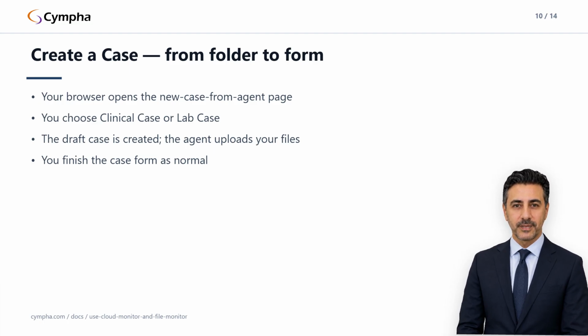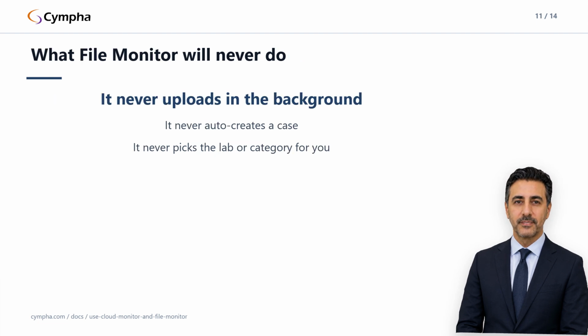Three nevers, and they're the design, not a limitation. File Monitor never uploads a file in the background. No scan leaves your machine just because it appeared in a folder. It never auto-creates a case. A case exists only when you click Create a Case and complete the form. And it never picks the lab, the patient, or the category for you.